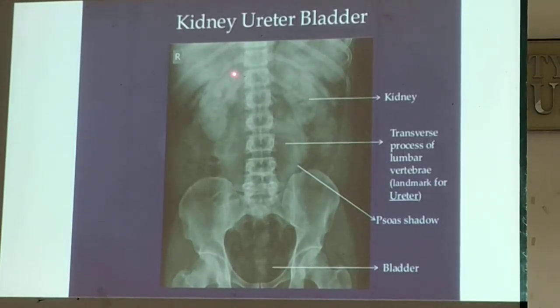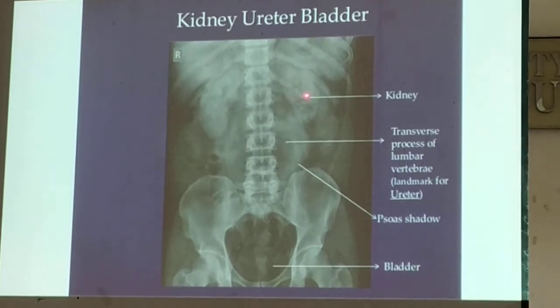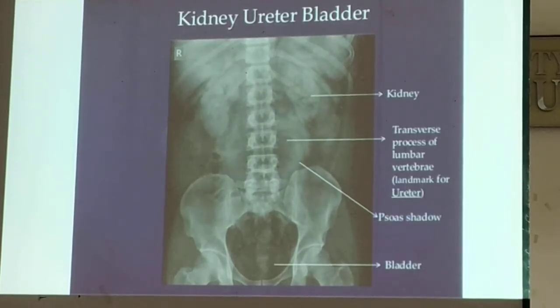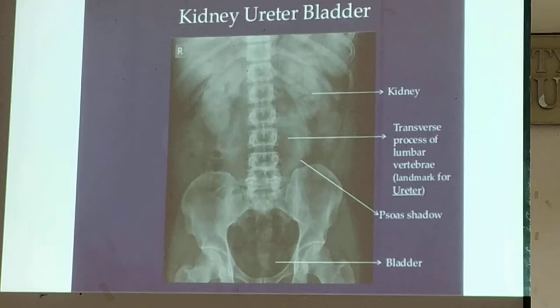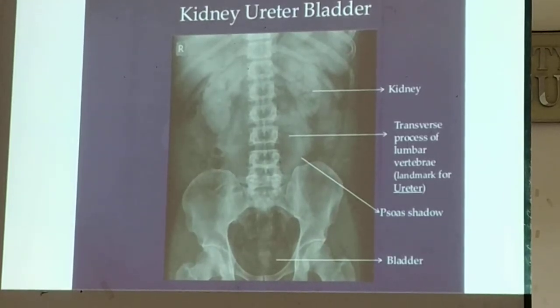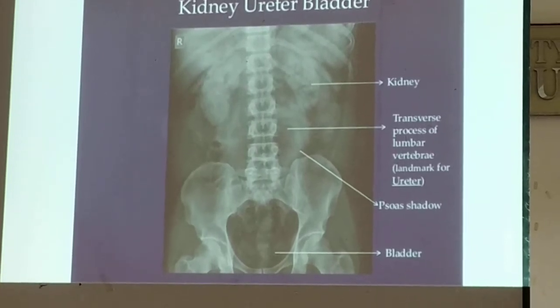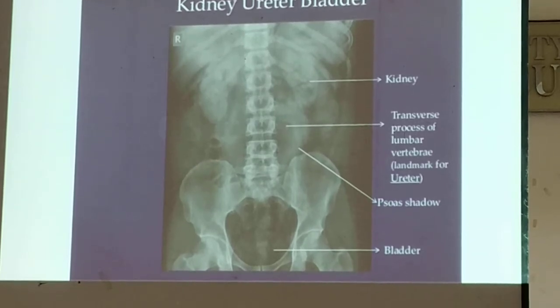So since the kidneys are very much prominent, well appreciated, and look radio opaque, that could be the effect of your contrast material. Because with the use of contrast material, the kidney, ureter, and the bladder would appear radio opaque. Okay?